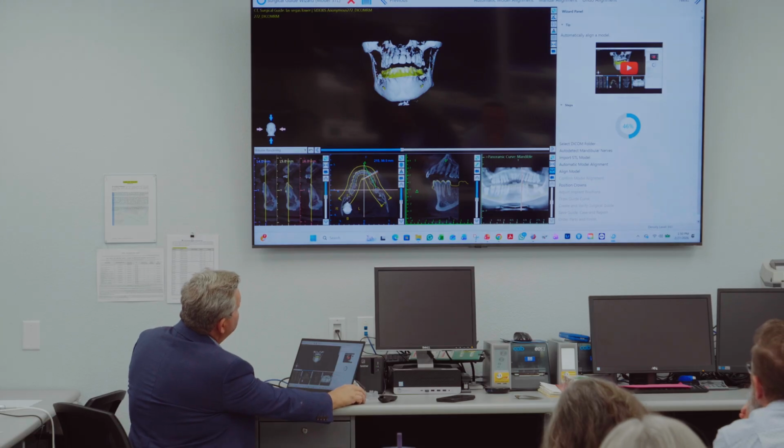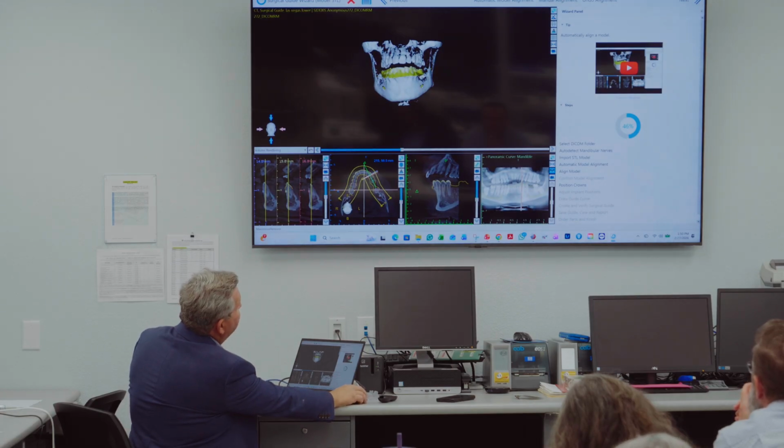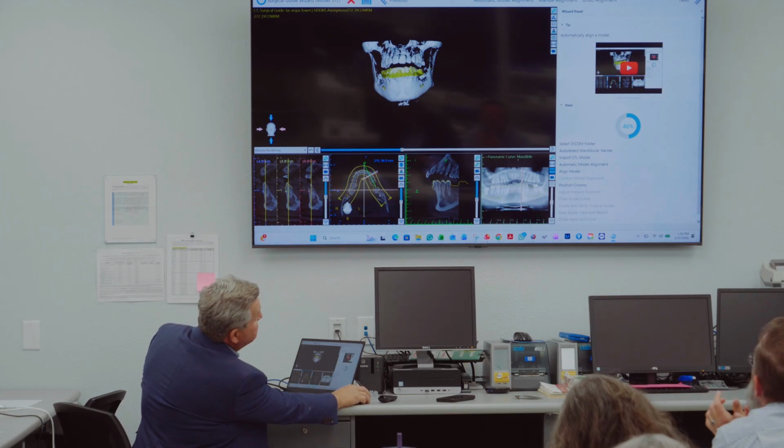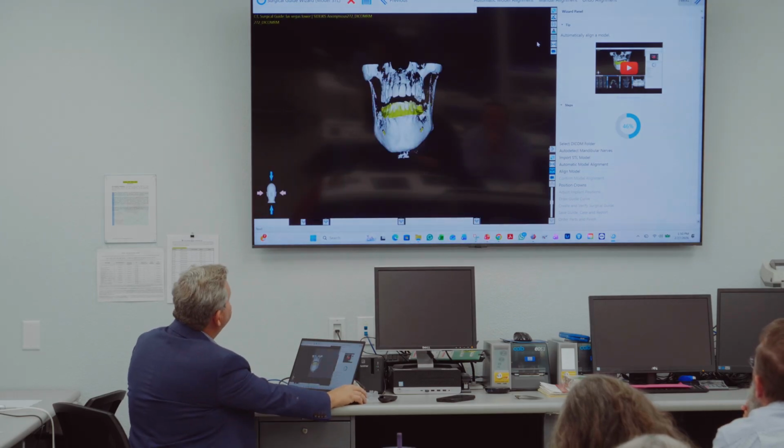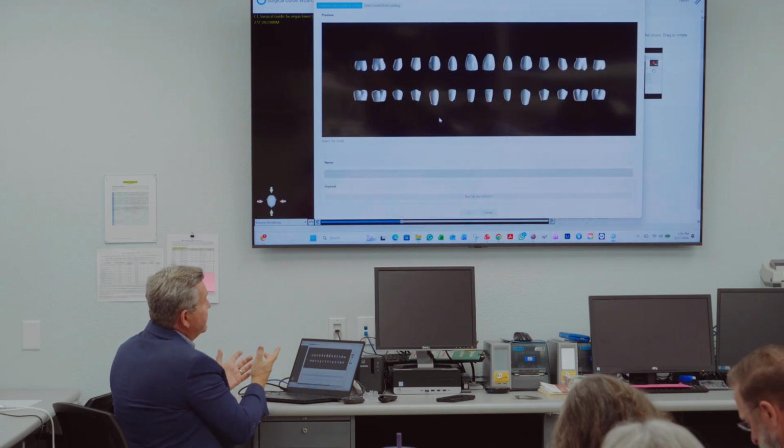All right, then you have the same thing here. This shows the contour lateral view of the slices with the same STL file. All right, once you're comfortable with the registration, and I'm telling you, it's going to be really good most of the time, click next. I can't see where the next is. There it is. Okay. Now we have to choose a tooth.